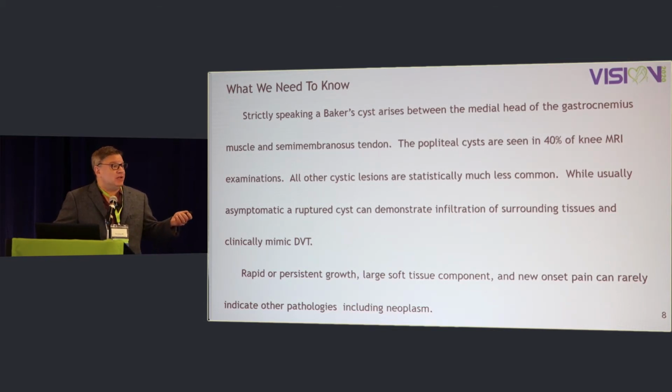If it ruptures, it'll clinically mimic a DVT, and we've had that a bunch of times come into the clinic. And in that case, it looks very infiltrative, fluid, dissecting along tissue planes. It's not nearly as nicely, sharply demarcated and defined.